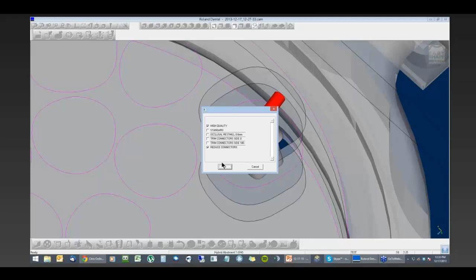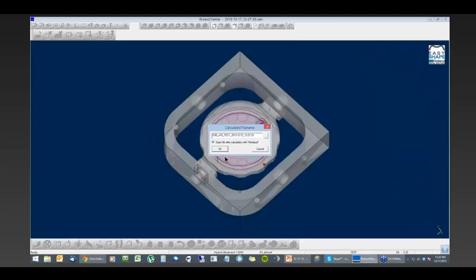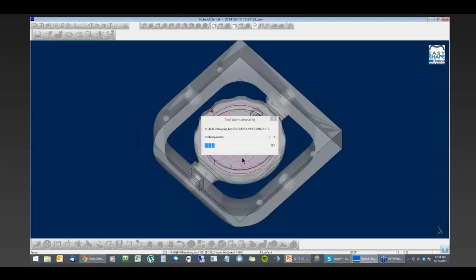One of the more important things that you definitely want to check out with your distributor before you try milling this is to make sure that they've actually incorporated the hybrid abutment milling capability into the software. If they haven't done so yet, when you import it, it may not even apply the correct tool paths, or it may not even calculate at all. So that's very important. Also, if it's not showing up under the selection menu, it could be because your reseller is testing that functionality first before they get it out to you. So definitely check with them before you try milling any of this.